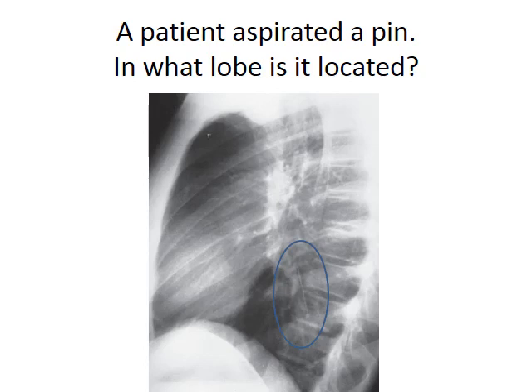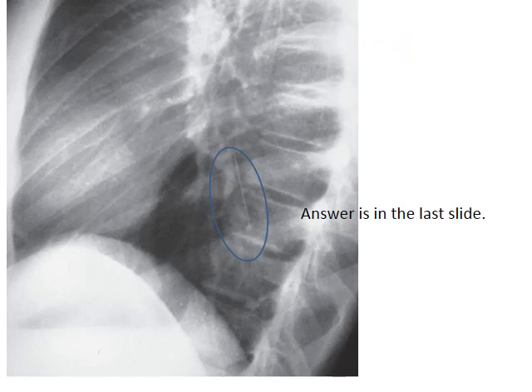The patient aspirated a pin. In what lobe is it located? So this is the close-up view. The answer is in the last slide.